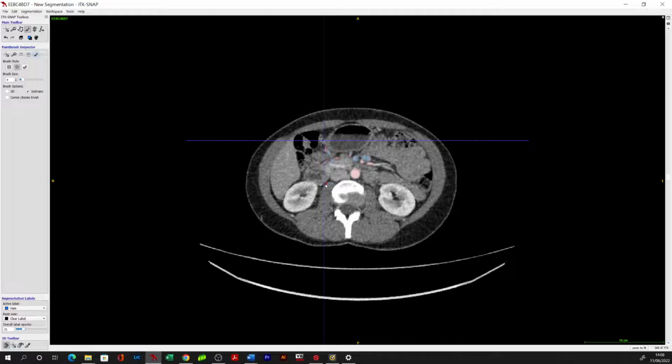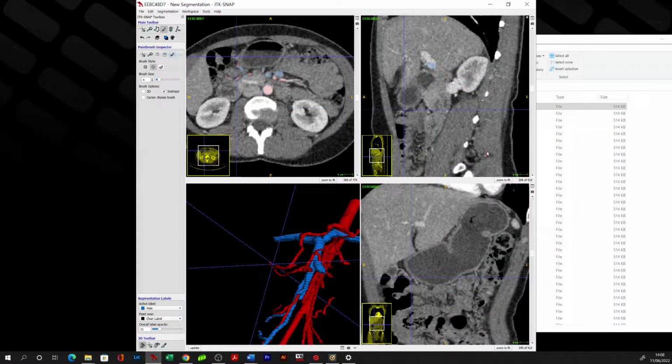I think we probably got the right interpretation off the bat, but it was certainly more difficult than it is now, because we've got the arteries already in. It's easier to follow vessels when you've eliminated the other possibilities. So you do have that advantage, and I think it's a big one when you're starting out.